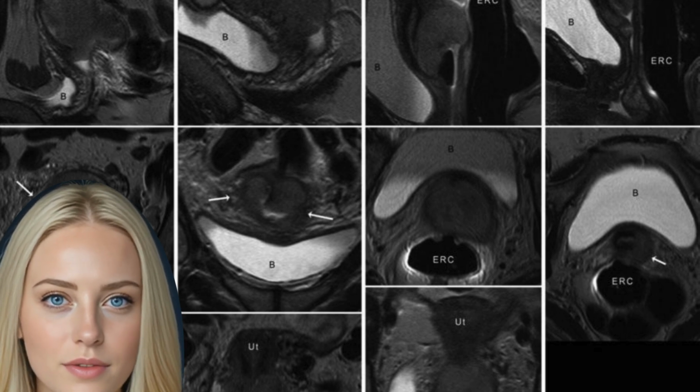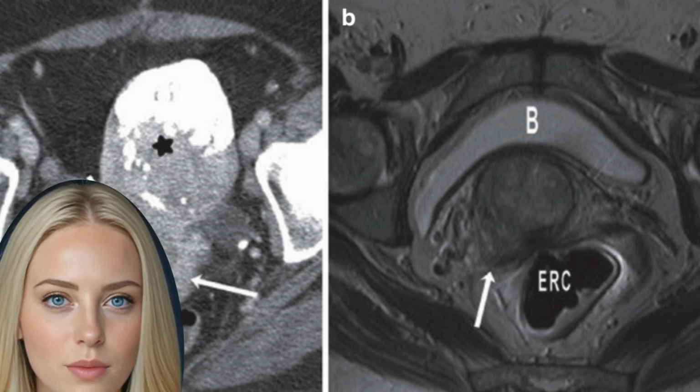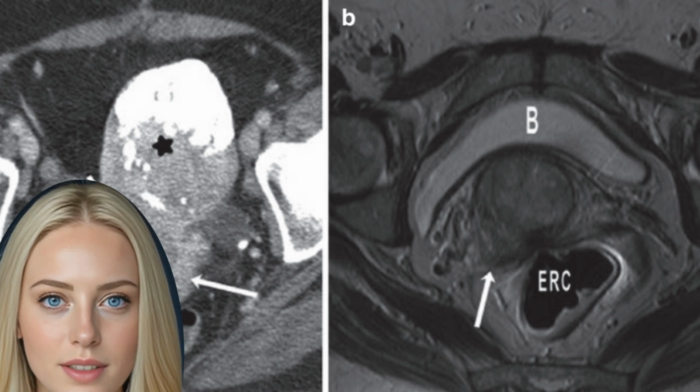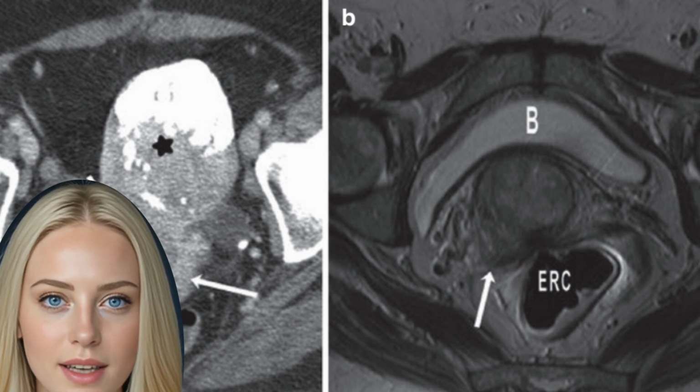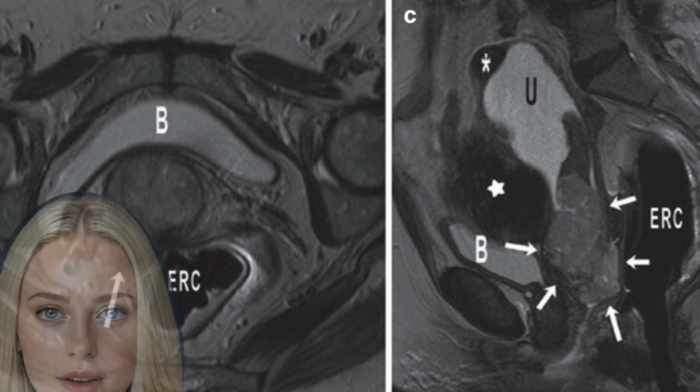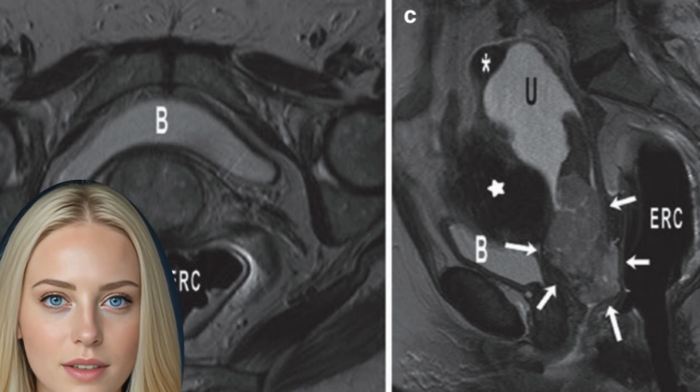The staging for cervical cancer is done according to UICC criteria, Union Internationale contre le Cancer, the most recent version dating to. While the intravenous application of contrast IV can be foregone during primary detection as the tumor is easily detectable in the native T2WI in most cases, such an application is compulsive for therapy control after brachytherapy, after combined chemoradiation or after surgery to differentiate between a residual tumor or scar-like changes.